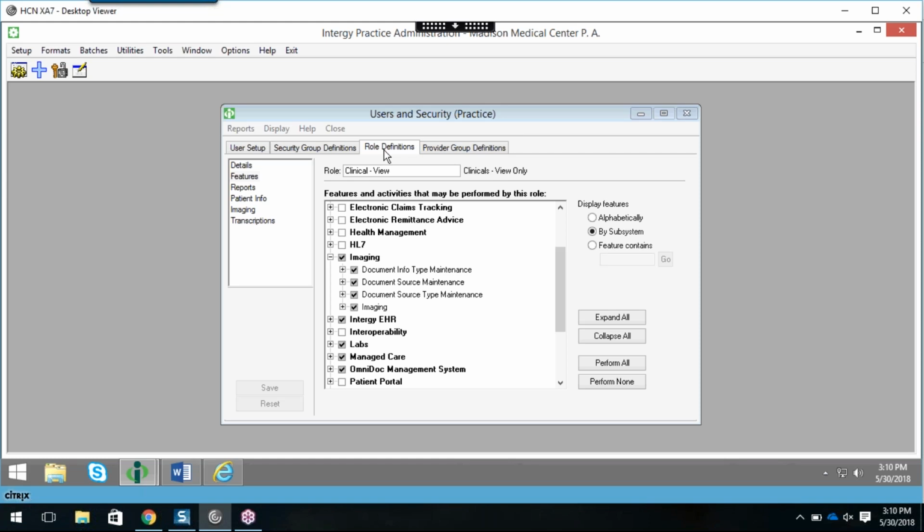So for example, for somebody that's a poster, that would be a role, and I would grant security access based on that role rather than the individual user. So in terms of knowing who has the rights to what and having control of that, and maintenance in general, it makes life a little easier.